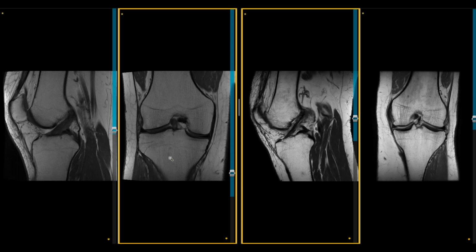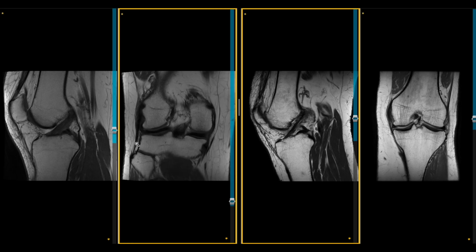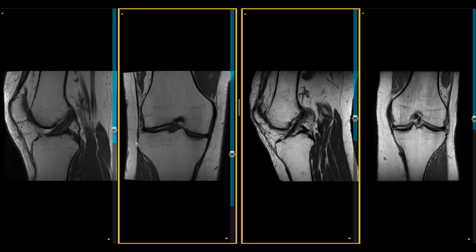So here are two follow-up MRIs on two different patients. The patient on the left shows the outcome of a normal thickness ACL healing, whilst the patient on the right shows the outcome of a reduced thickness ACL healing. So when I start on the patient on the left, you can see as I scroll through these images that the ACL remains of uniform thickness along its entire length from the tibial through to the femoral footprint of the ACL.